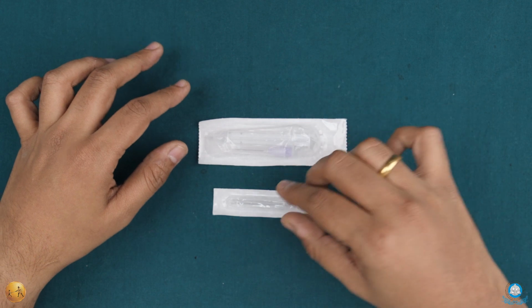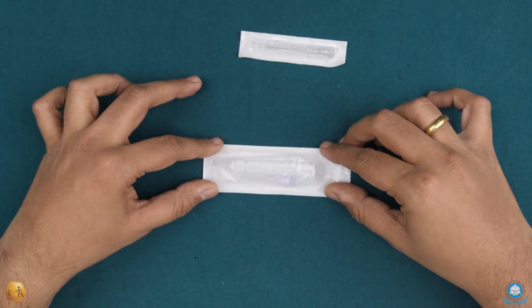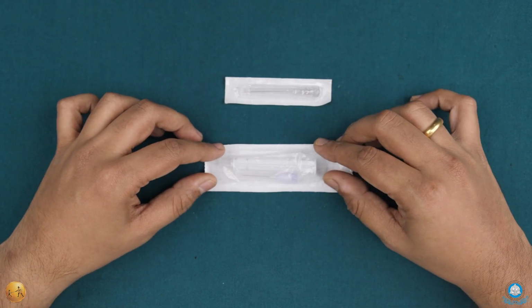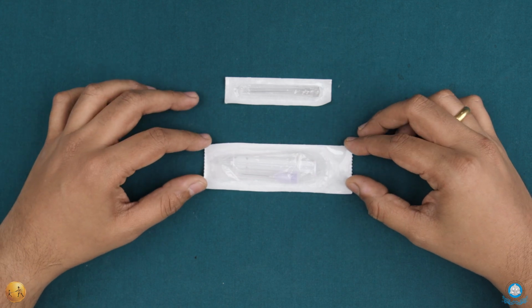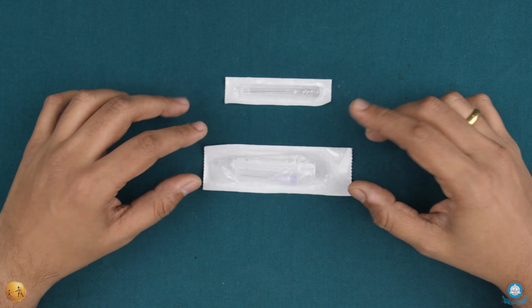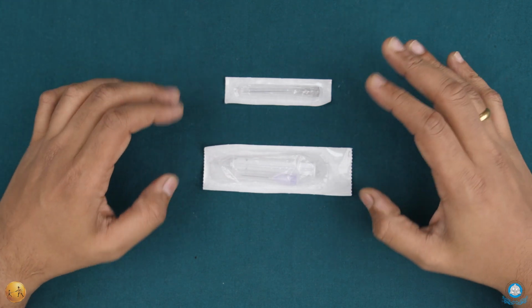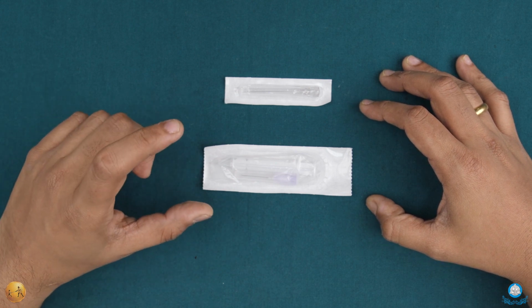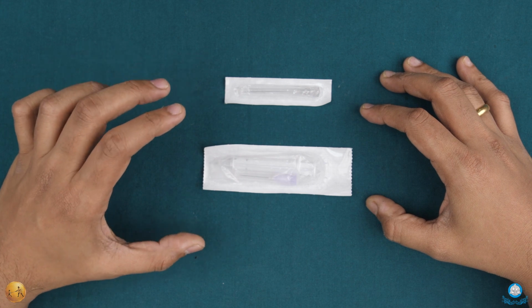Now with this, let's first start out with the disposable syringe. A word of caution, please remember that the disposable needle syringe system is basically used along with a vial of local anesthesia. Okay? As a side note, kindly understand that the bottle of local anesthesia or the 30 ml packaging of local anesthesia is what is called a vial.